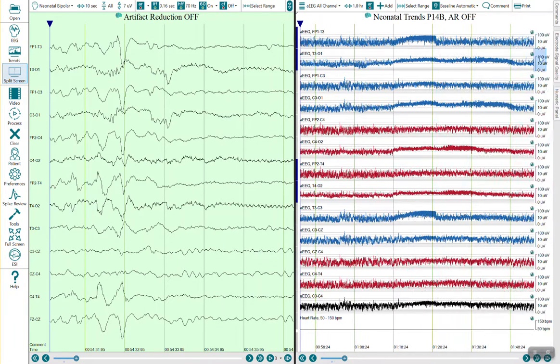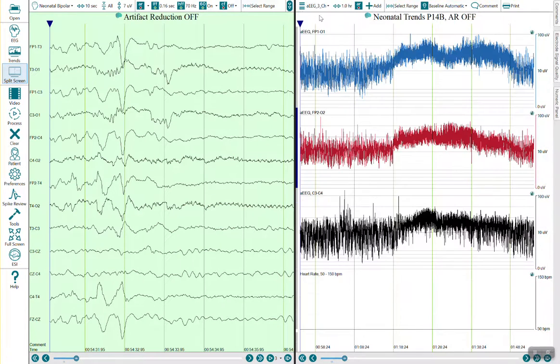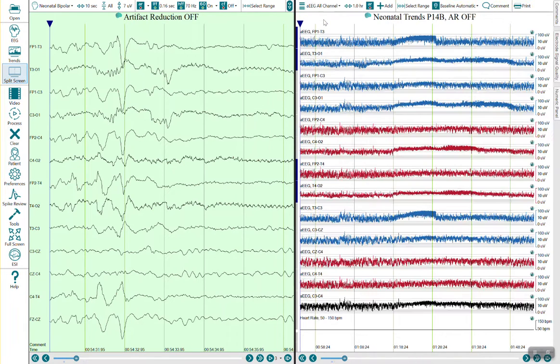And you notice over on the right here, we're already showing the values. Now, by default, it's going to show the scaling for aEEG, and that's scaled 0 to 10 microvolts for the bottom half, and then it goes 50, 75, 100. Now, if I look at a 3-channel representation, it stretches that out a little bit more. You can see those gradients a little bit easier, but there's the 0 through 5, then up to 10, 50, 75, 100 microvolts. Let's go ahead and switch back over to an all-channel representation.